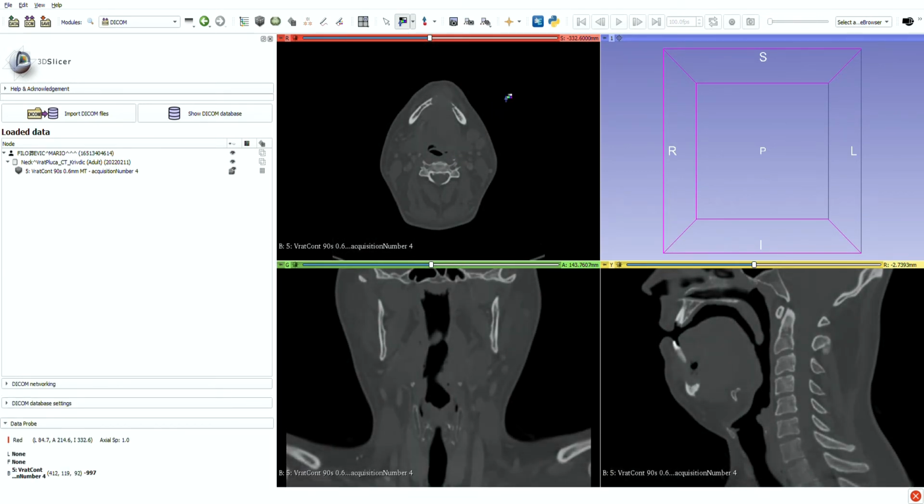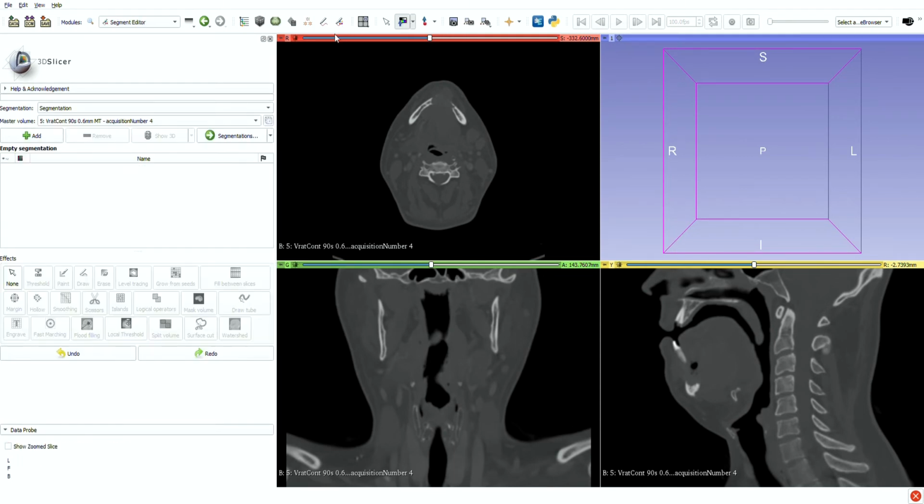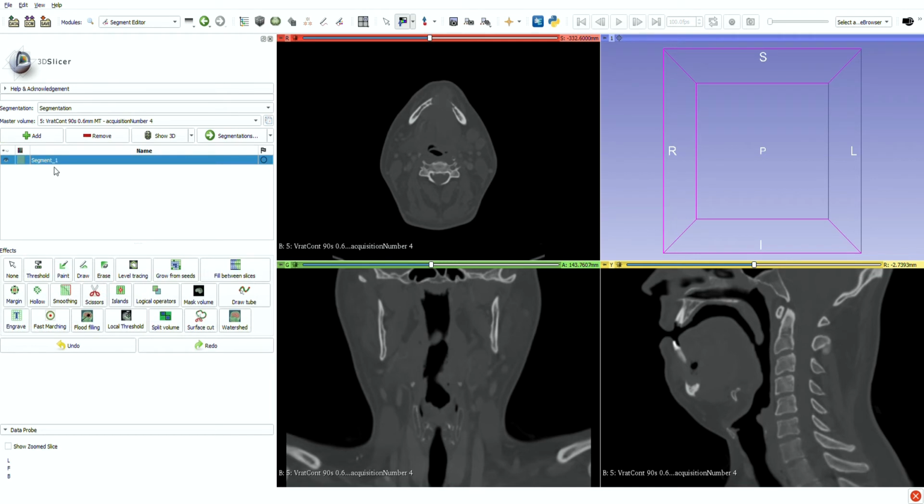Okay, this will be okay. And now I'll perform a segmentation. Because of the privacy, I won't write the name here. I usually do. I'll do it after the recording.